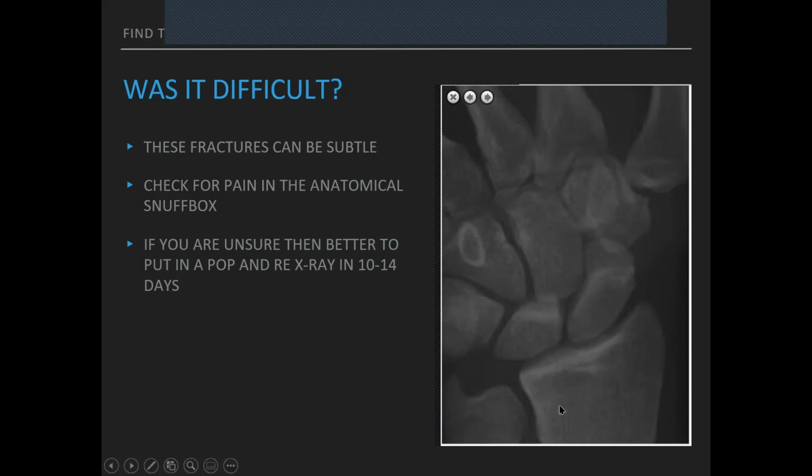Now, let's have another look and see. Can we see a fracture anyway? All right. So we can. There is a fracture here. So the fracture is quite subtle. You can't see it all that easily unless you really look for it.